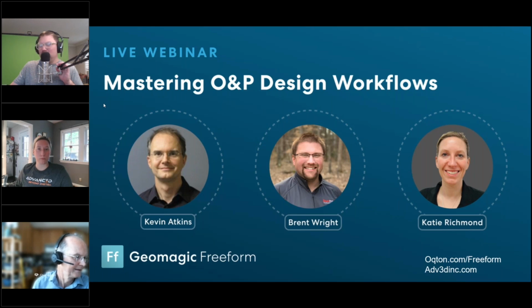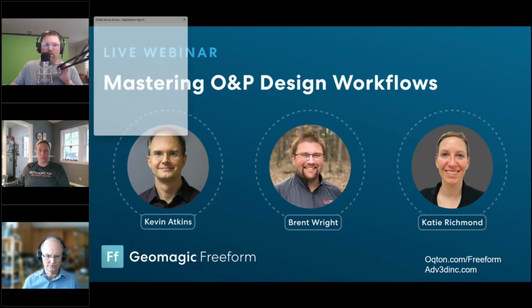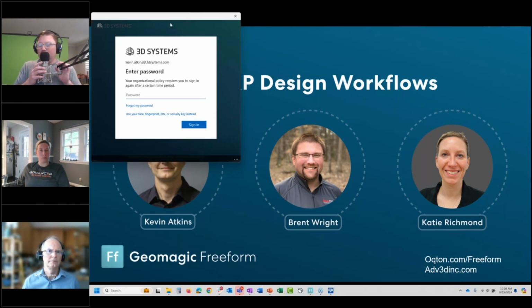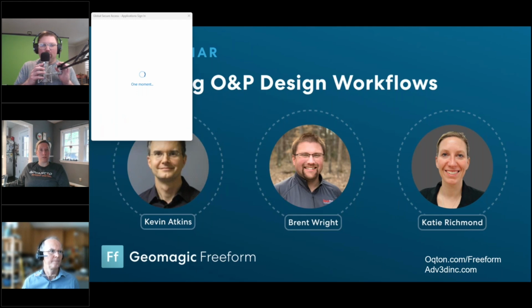Katie said, good job. Can I use a PDF file to start a sketch? I don't see why not. Probably it depends on what it would be for, but I would say most of the time you're going to want to do that in your parametric software if you're actually wanting to create something from there.